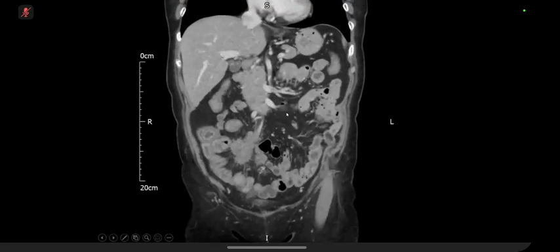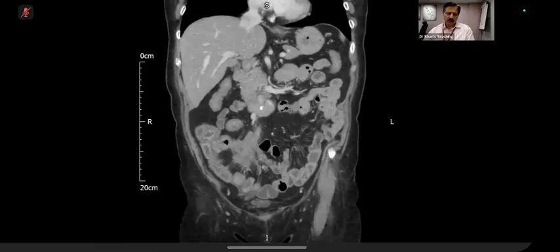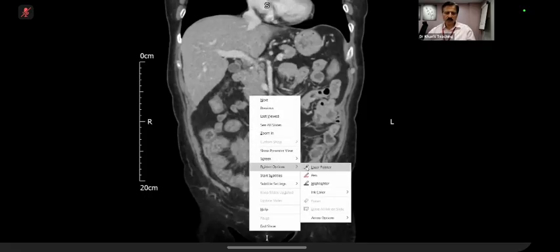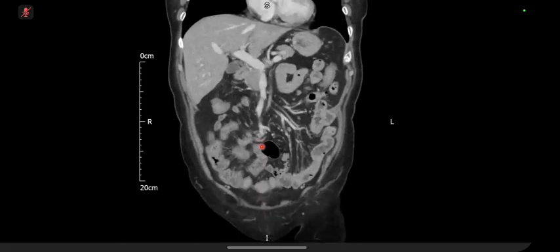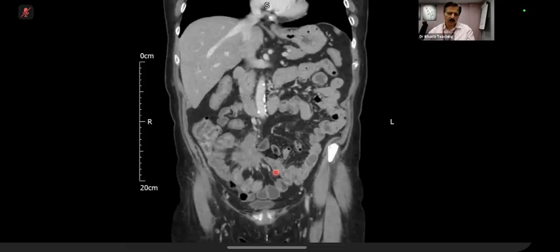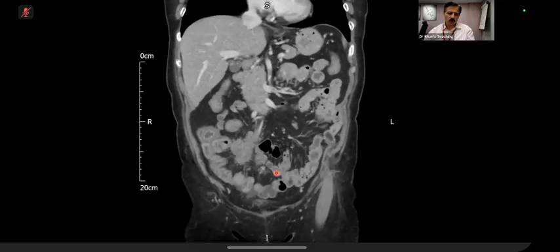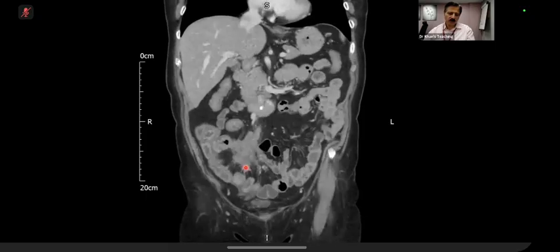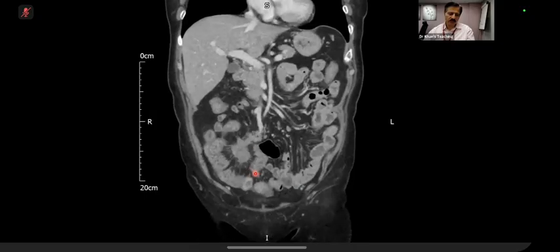Concentrate on this case, and this is a very important concept which you have to remember. This also is a case of lymphoma. And here, what is happening is, it will tell you that this soft tissue is a lymphoma. You did well in your case where you were trying to rule out a carcinoid. And carcinoid classically will also cause desmoplastic reaction. There might be calcification. But what happens? This lymphoma is sitting in the mesentery, and you can see striations around it.